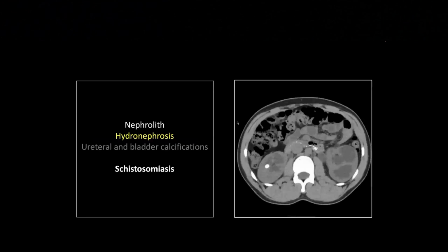All right, this one is a case of schistosomiasis, and you will see this. It's apparently very common in Somalia, and the more Somalia becomes a failed state, the more immigrants from Somalia we receive, and they do bring schistosomiasis with them. So this one, it's funny, when I actually used this for the Jeopardy game a couple weeks ago, everyone started vomiting XGP when they first saw the kidneys. And that's not unreasonable, right?